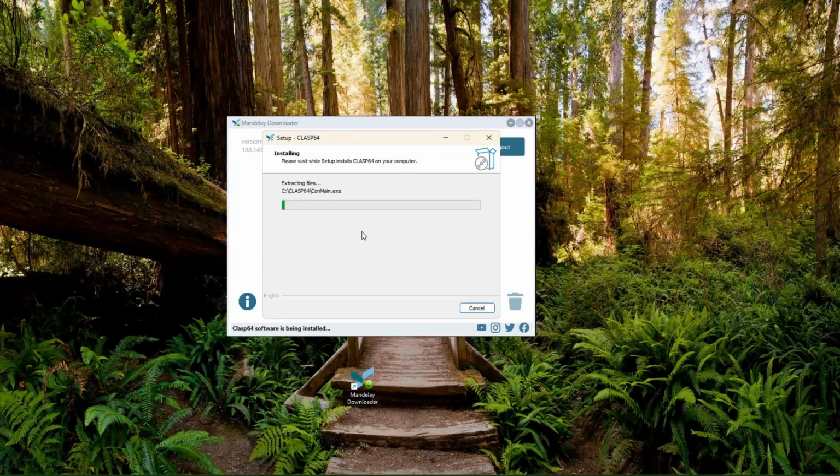And a new part in this installation for the future: when you do the installation, the system will ask you 3 questions. Let me wait and I will show you.